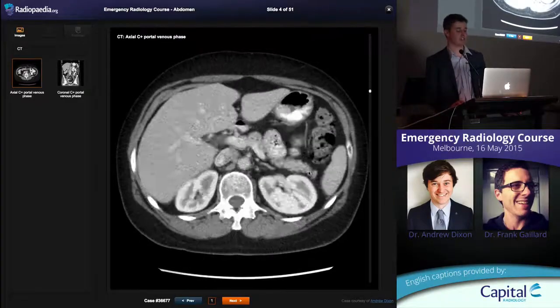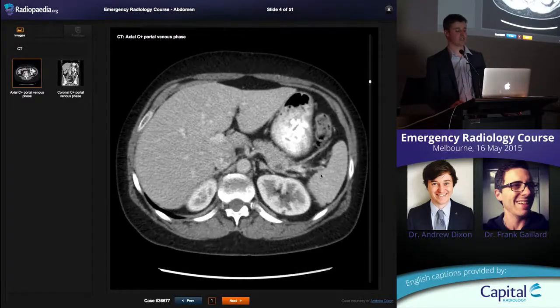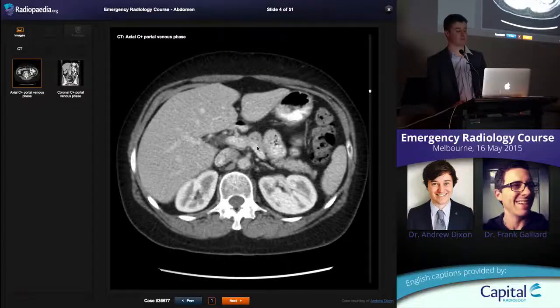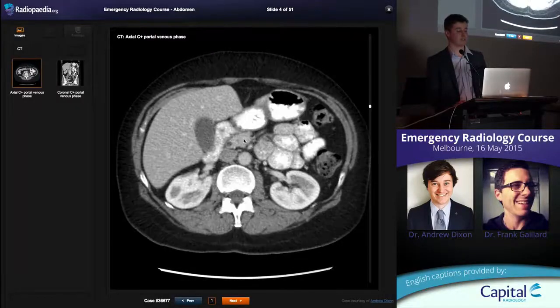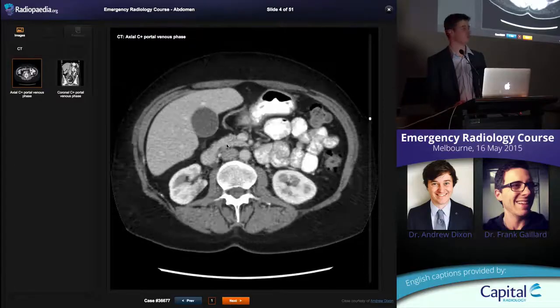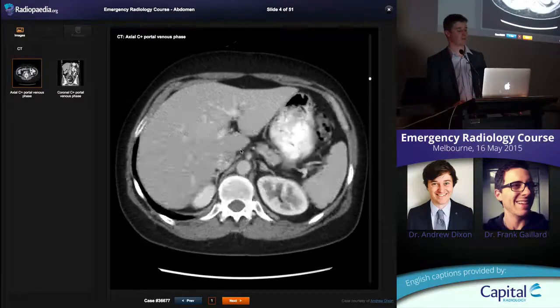Okay. Pancreas is difficult to trace. This is the pancreatic tail. It always starts up near the splenic hilum, so you can start finding it from there if you want. And then the pancreatic tissue comes along here, comes down here. This is towards the pancreatic head, this stuff here. It's a tough organ to trace if you're not experienced, okay?